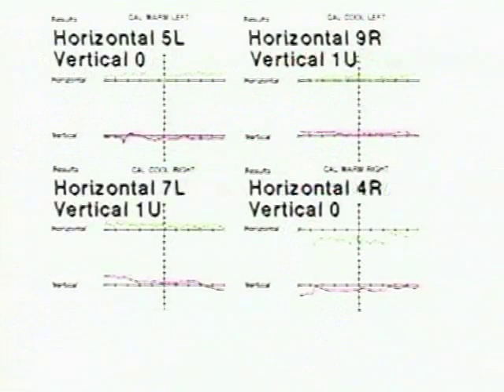In the last patient, we see significantly diminished responses in both ears. This is indicative of a bilateral vestibulopathy from ototoxicity that the patient sustained after being treated with a prolonged course of aminoglycoside antibiotics. In this particular case, we see that the responses are not completely absent, but however are suboptimal and indicative of a more elderly patient with bilateral ototoxicity.